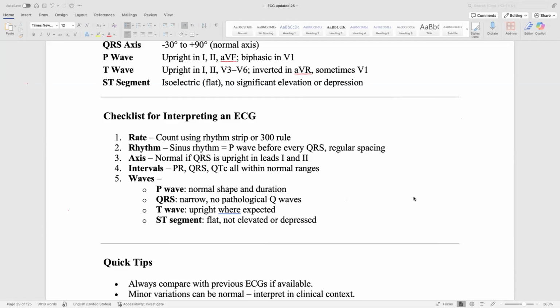So when you read the rate, you need to link the abnormality to the medical significance of this abnormality, and what is the cutoff point for each. So above 100 in a patient with shortness of breath, you need to rule out pulmonary embolism. If it is above 150, you need to suspect SVT, because it is very rare for a sinus rhythm to be above 150 at rest. And in that patient, you can try adenosine, for example, if there is no contraindication. All right.